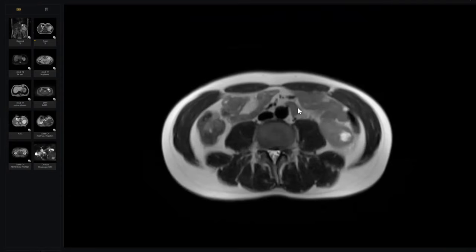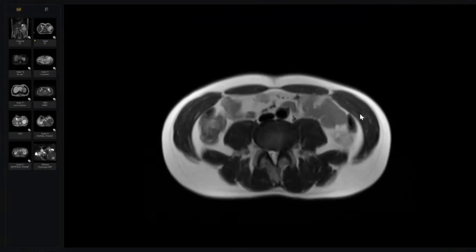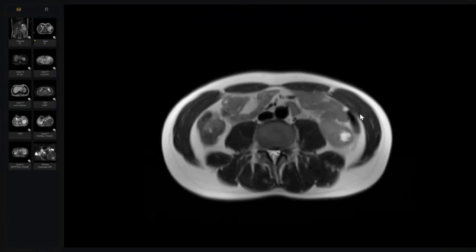Could you tell me the aspect or the direction of biopsy for this lesion? Which direction would you go from? I think posteriorly, sir. I can go from the posterior aspect. Okay, thank you, doctor. Let's take it from the posterior aspect. Let's take some home message.